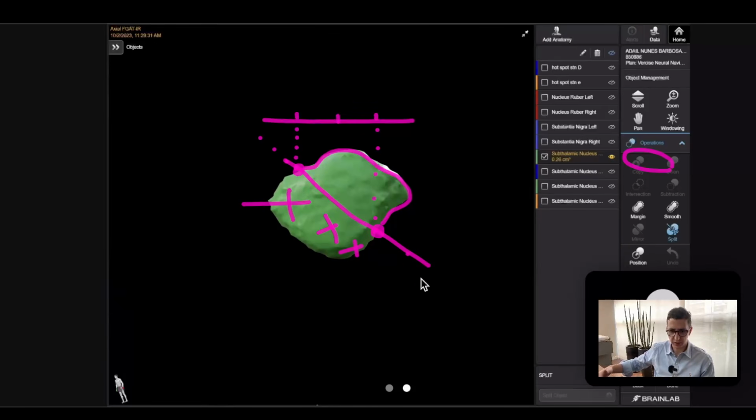I'm going to do a little bit here with you. For example, here, or here, or here. And once you do that, okay, for example, here.